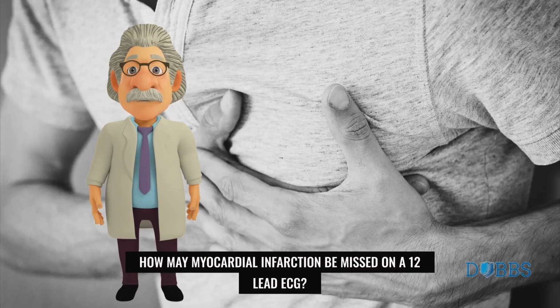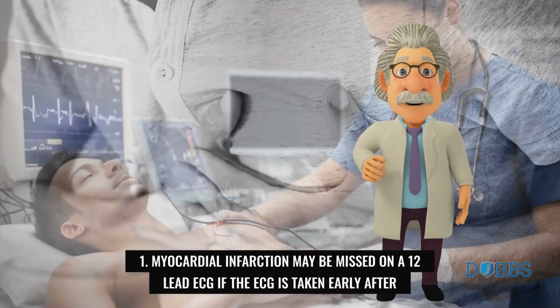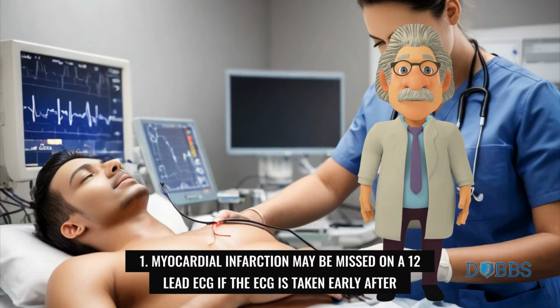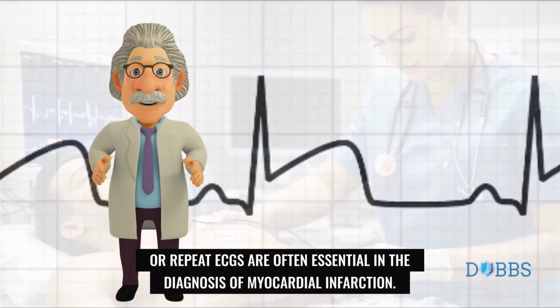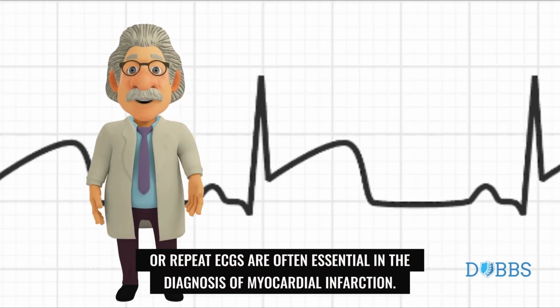How may myocardial infarction be missed on a 12-lead ECG? 1. Myocardial infarction may be missed on a 12-lead ECG if the ECG is taken early after the onset of chest pain. This is why serial or repeat ECGs are often essential in the diagnosis of myocardial infarction.